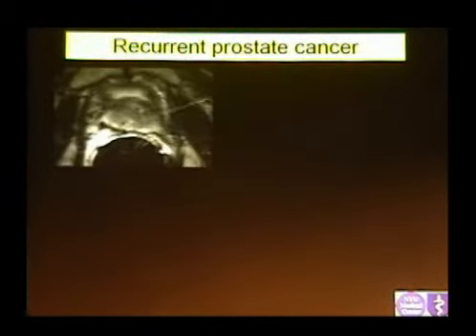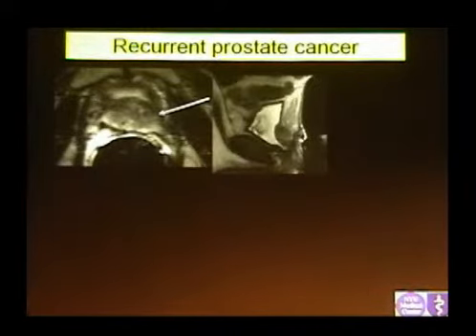Another case we had is more interesting because I was kind of puzzled by it. When I read the case initially, I didn't have any clinical information. The patient wrote down, I had my prostate removed. And I was looking at the image, and it looked like a prostate to me.